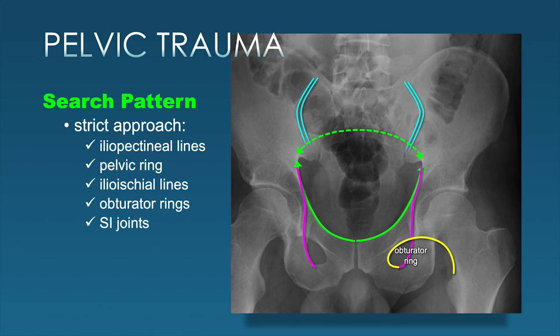We can see the anterior SI joints more prominently than the posterior SI joints on the AP view as well, and try to look through the bowel gas, get an idea of those sacral arcuate lines where the sacral foramina are, if those are nice and smooth and undisrupted. And then look at the pubic symphysis as well. So those are the lines that we're going to focus on on typically a portable trauma radiograph shown in the trauma bay.